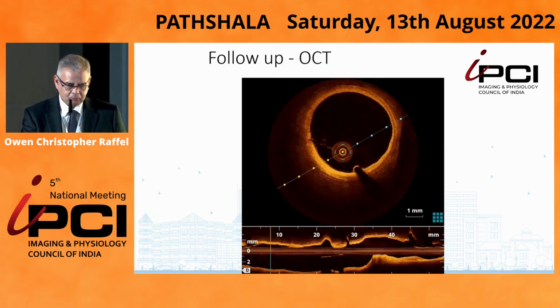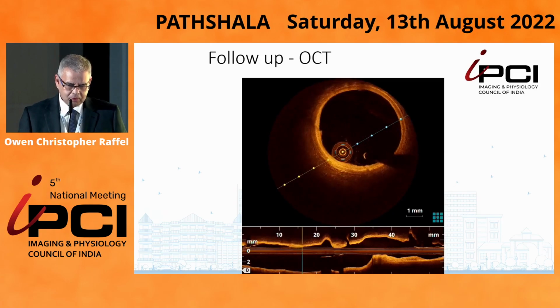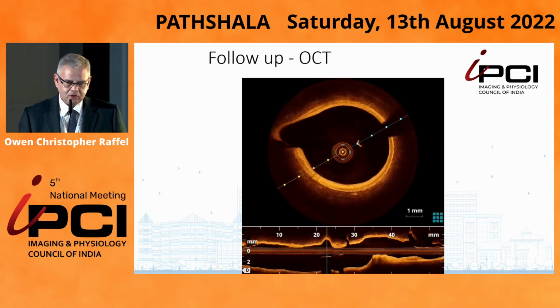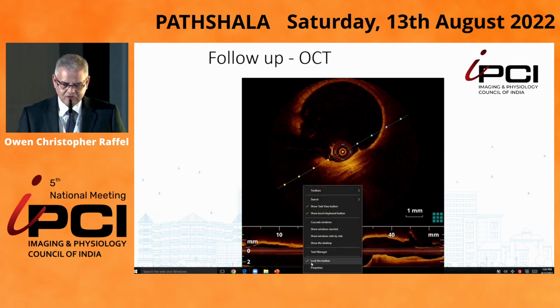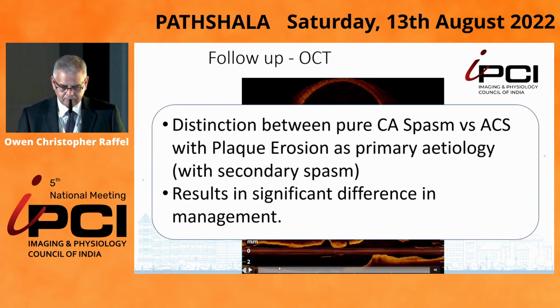In the interest of time, anyway, there's just essentially layered plaque.